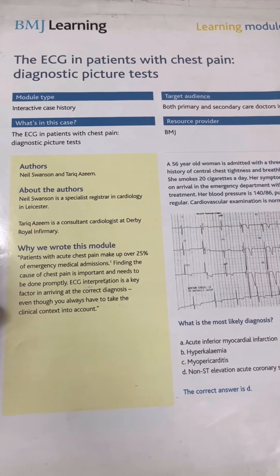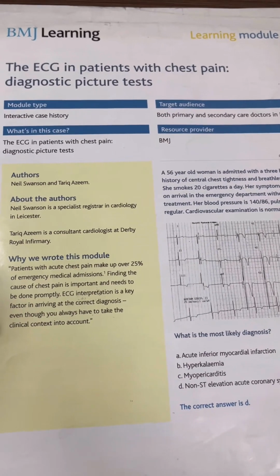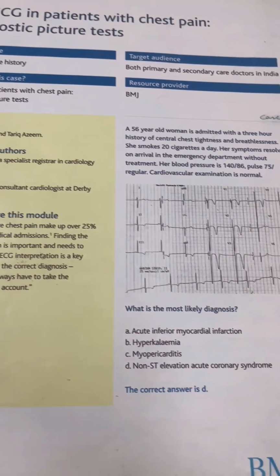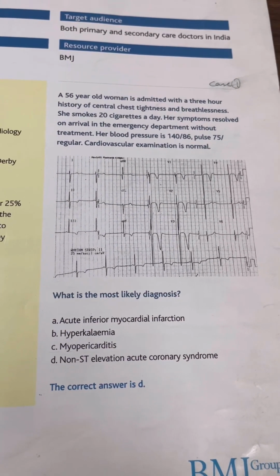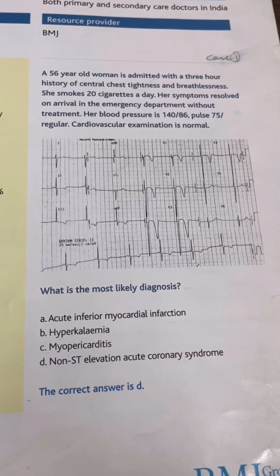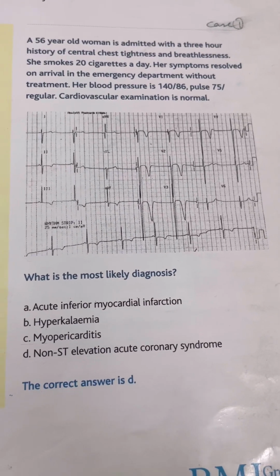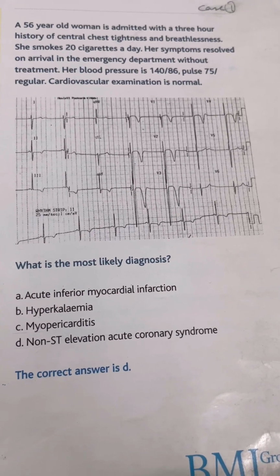I will discuss with you the ECG in patients with chest pain. This is a very old BMJ learning module which some pharma company provided to me, and I found these 3-4 cases very interesting, and they will make you very confident in dealing with ECG-related problems. So today I will discuss the first case, and then I will try to complete this module within the next 2-3 days.